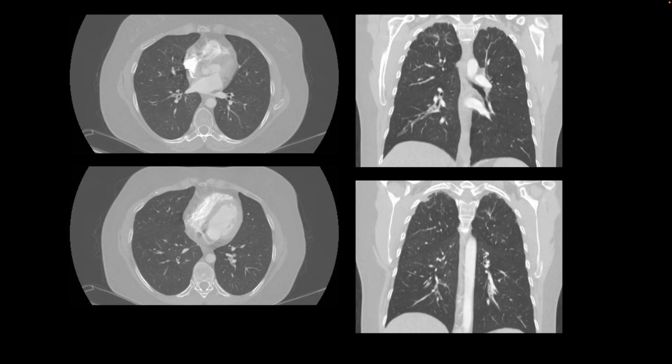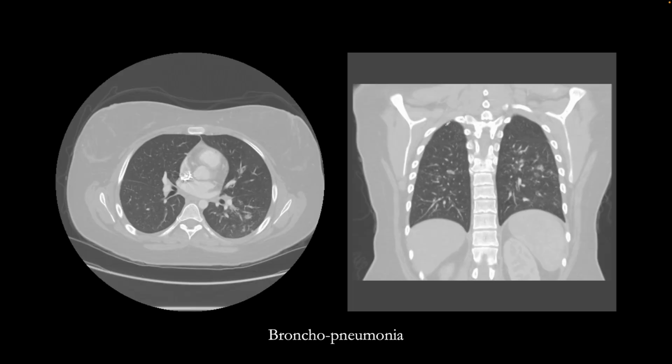Here's our next patient. The next category of findings seen on these studies is from infection. And here, pay attention to the airways. In the right lung compared to the left lung, there is mural thickening, also seen here and also seen right here. This is from bronchitis. There may be some filling defects from secretions inside the airways also. So infection also can present with PE-like signs and symptoms.